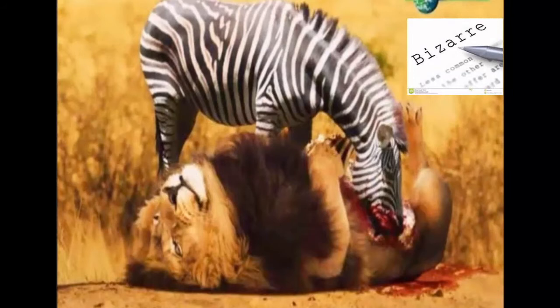The next important thing I want you to remember is that whenever you see a bizarre ECG, you must think hyperkalemia.